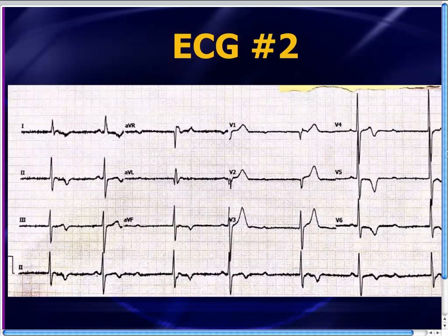And you'll also notice that in this particular case, you've got, let's see, 1, 2, 3 P waves for every 2 QRS complexes before the drop comes, and then you start the cycle over again. So this is a Mobitz 1 with what would be called 3-to-2 conduction. In this case, you do have enough P-QRS complexes to see that the PR interval is gradually increasing, and then there's a drop. For whatever reason, the atrial rate dropped down to 60, which is really low, and you get this really long PR interval. I'm not sure why the PR became so long.